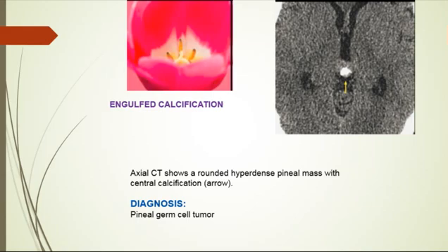Okay, you should also try to look for the internal cerebral veins superiorly, the midbrain tectum anteriorly, the cerebellar vermis inferiorly, and the tentorial incisura posteriorly. In adults, physiologic calcification can help to identify the pineal gland. For true pineal masses, the pattern of calcification is helpful.